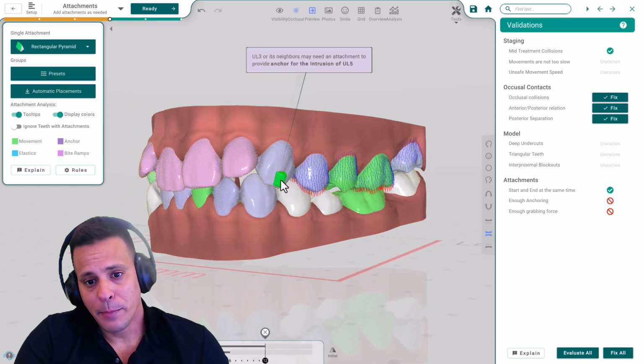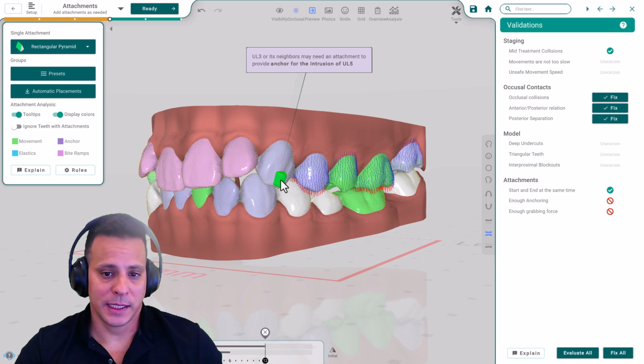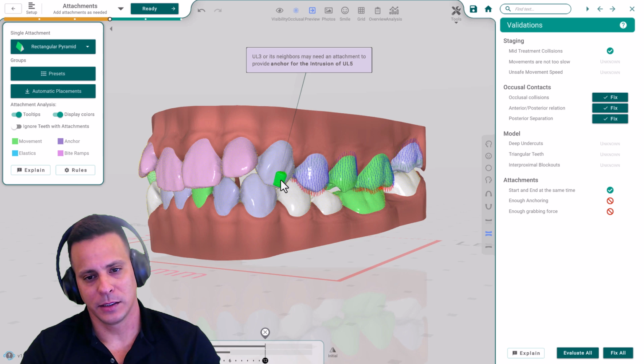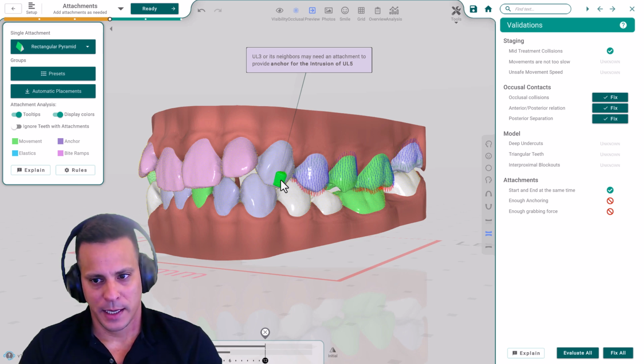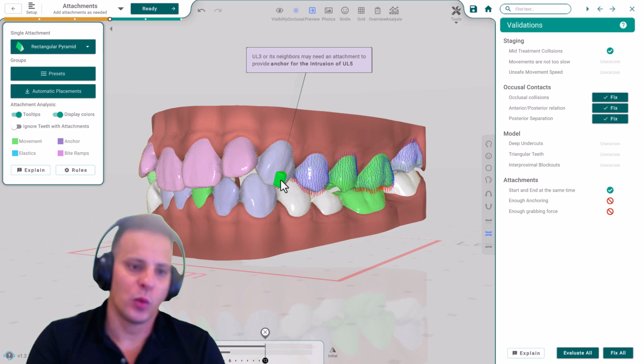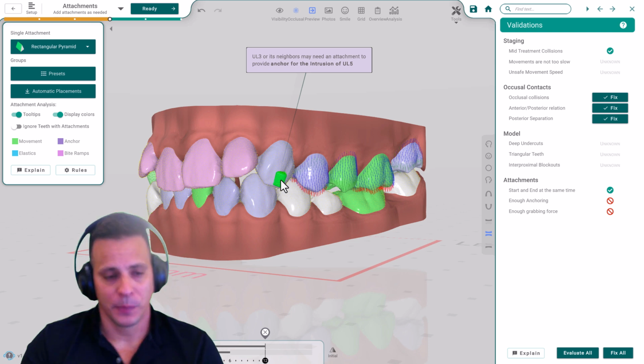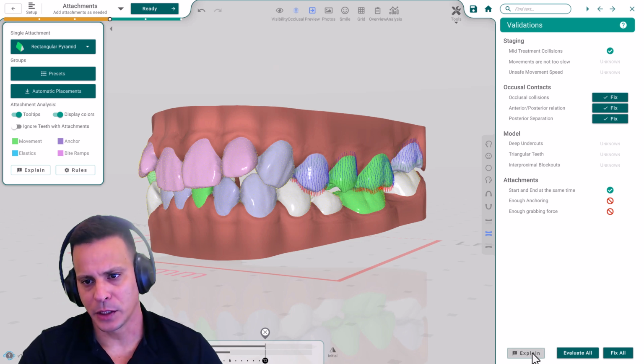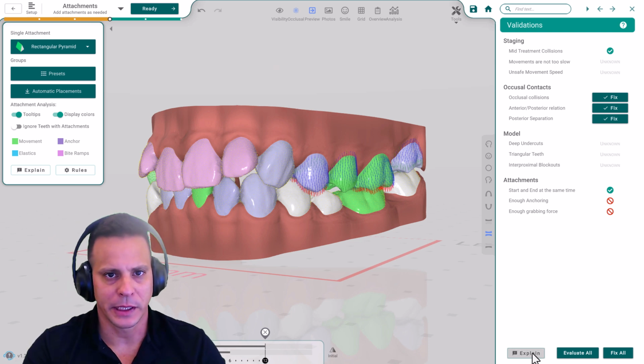It may be fine. We're just giving you the suggestions, and it's up to you to decide where to place them. And this is what we have right now with the analyzer. But the next step after this, oh, you already saw it, when you click here, we can explain that to you as well.